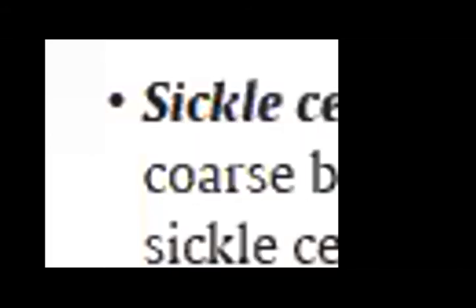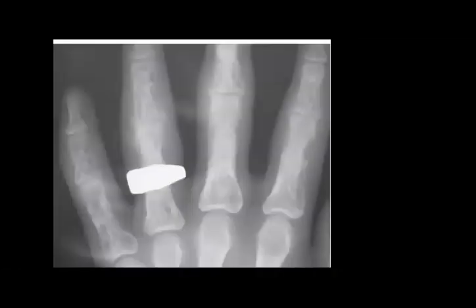So central H-shaped depression. I just want to confirm that the image is clear. So what do you think about this? How do you describe it? Sarcoidosis. Would you describe it as sarcoidosis, or would you differentiate it as sarcoidosis? Fauzi, I know your voice. So what do you think?